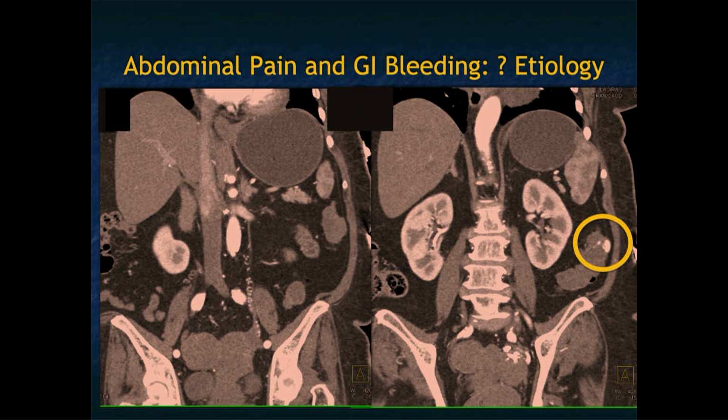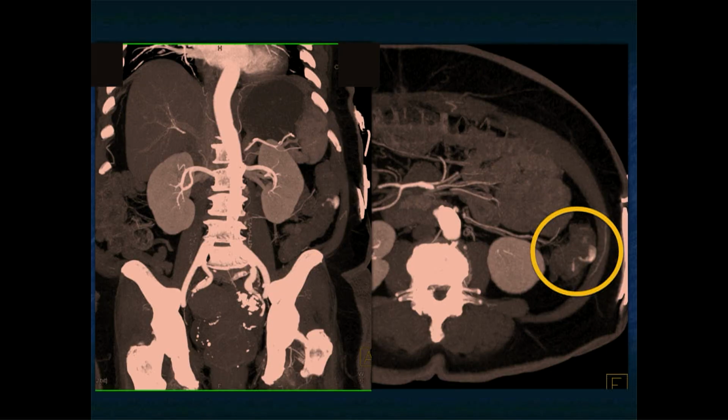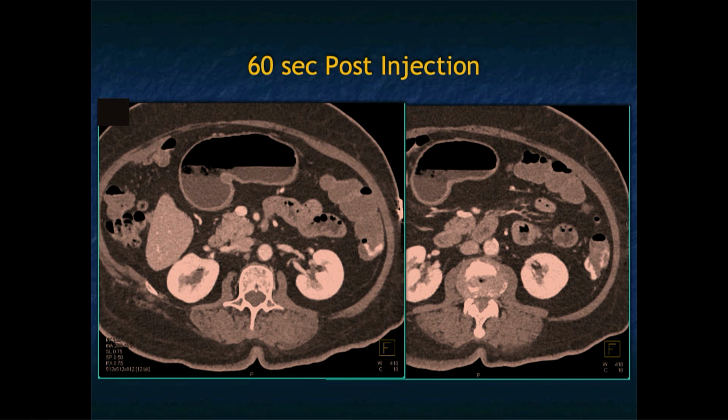Here's another classic example. Now, in a diverticulum, you can see it across the board here. Again, one challenge at times is that diverticuli often have high-density material in them. Going back to measuring things, if you have an active bleed like this case, here it's only one area, so it's easy. But besides the shape changing, which you can see here, the density changes. If you have a diverticulum with high-density contrast, on arterial phase and venous phase, it's going to stay the same. It's also typically higher than bleeding.